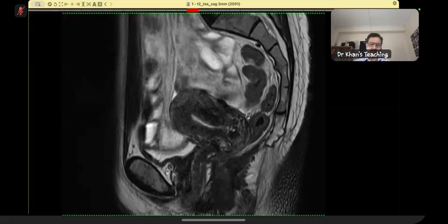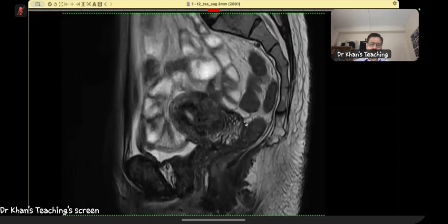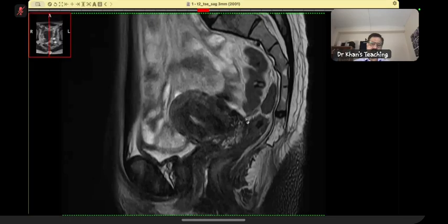This is the peritoneum lining, this is the cul-de-sac, and it goes and attaches to the rectum. On a sagittal sequence, trace it to both sides. So I'm going to one side. As I'm going to one side, you can see here peritoneum, and look at this, it is thickened. So this is a plaque of endometriosis with an adhesive band.